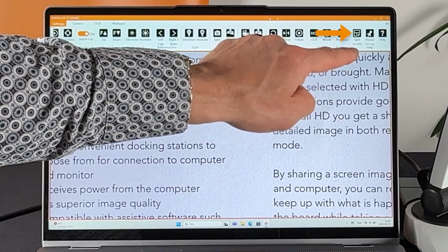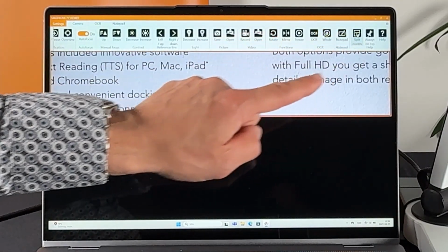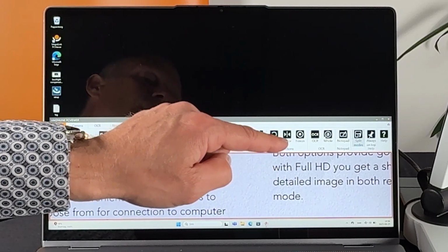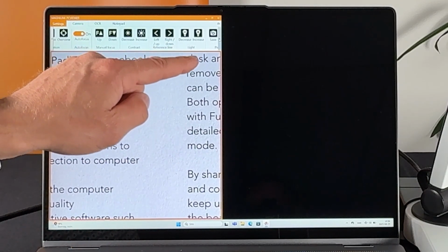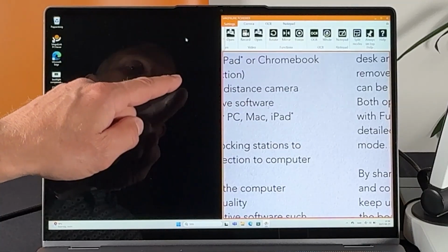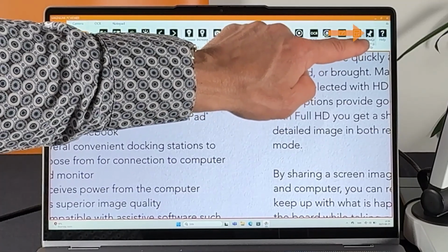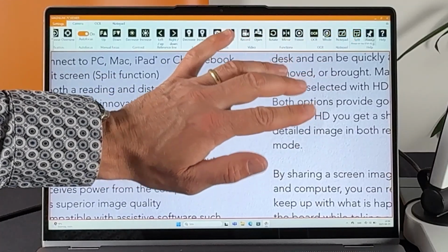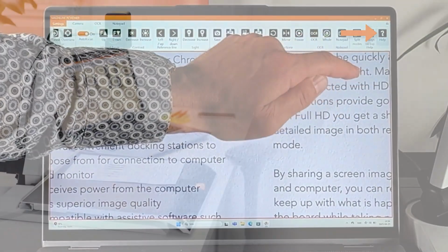Split modes. Press to toggle between different available split modes. Choose between horizontal split and vertical split. Always on top. Make sure that your MagniLink software is always on top on your desktop. The Help button activates the user's manual.